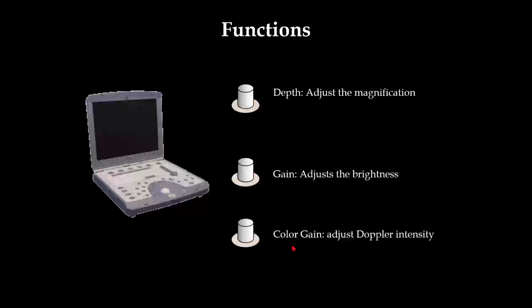Okay, and then the color, when you put it, you will see the color flow in that color window. So my question to you people is, you can write in the chat box or you can unmute and speak: what does the red color represent? What do you mean by red flow and what do you mean by blue flow? Anyone? Great. So blue away and red towards. Very nice. Good.